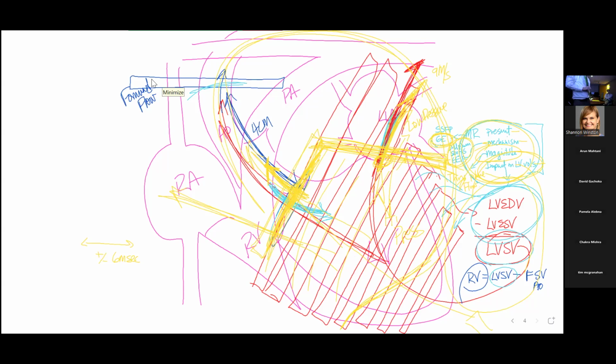And do you consider coronary flow when you measure flow above the coronary ostia in the AO, comparing to the LV stroke volume? Yeah, you can. People originally, the question is right in this area here, where we've got the coronary arteries coming off, right in here and right in here. Now, you can get a pretty sophisticated high spatial resolution image and actually measure the flow and measure the flow reserve, and I spent a lot of my career doing that.